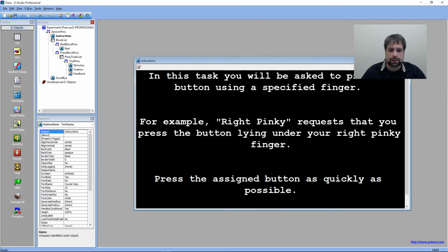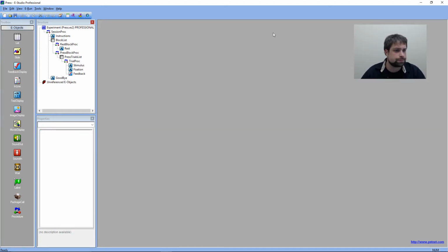Now, of course, the task is kind of written like you're in an fMRI environment. So it's written in such a way that they already have a button or a hand unit underneath their hand, and they just press any button on there. This is keyboard enabled just because we do have a keyboard and mouse setup here today.